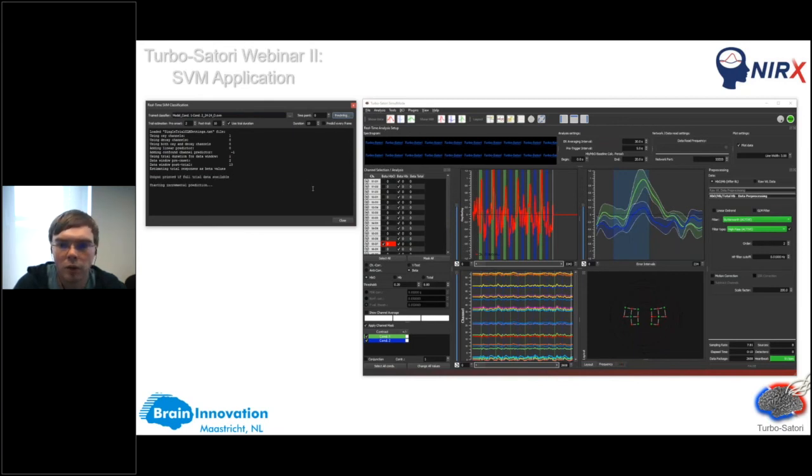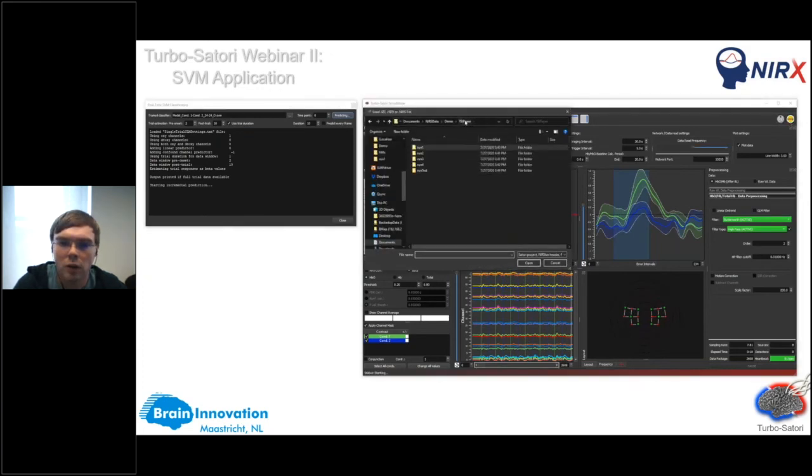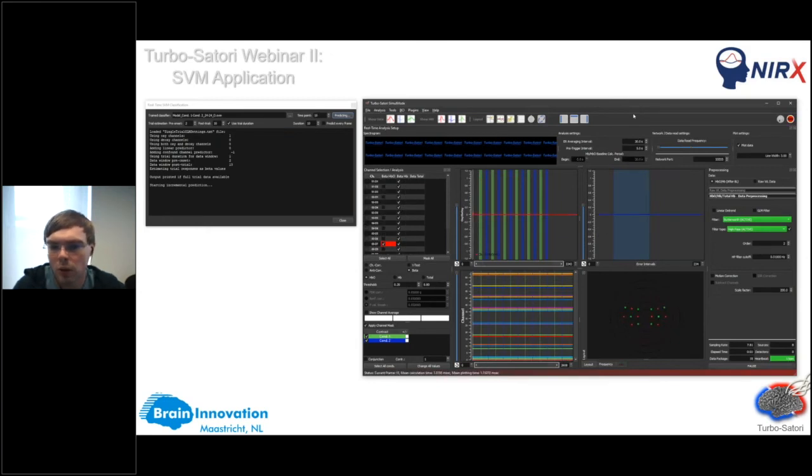and now it's waiting for data to come in. I just make this one a bit slower so that it doesn't read the data too fast, and I run my run test, so the independent data set. This run test can also be, or is supposed to be, a real run, so in the real world, and not an offline one.